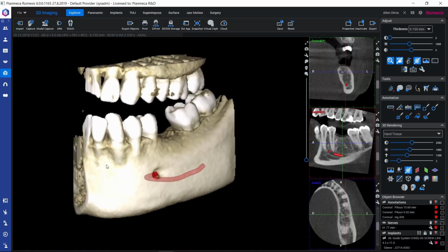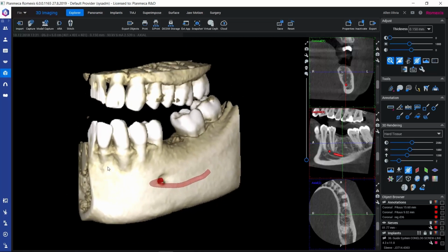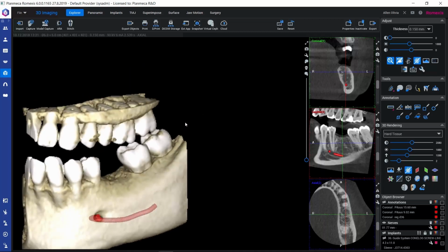Then we can panorate this volume around by, for example, keeping both our mouse buttons down, or we could keep our right mouse button down and the Alt key on the keyboard and move it around. And if we would like to center the volume based on some specific point, we could right-click on that point and the volume gets centered according to that point that we clicked.